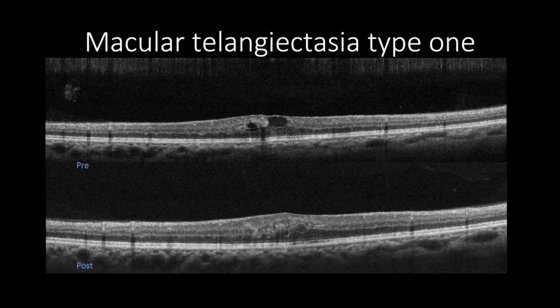This case shows increased retinal thickening at baseline with cystic formation and hard exudates. Post-treatment cross-section shows an improvement of both central macular thickness and cystic formation.